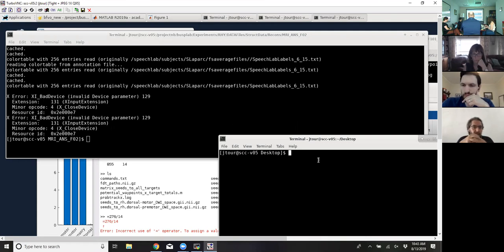So I could do something like subjects dir equal. Okay, and whenever I do this, you always want to use your tab out. Not only does it save you time, but it confirms that you haven't made a mistake.